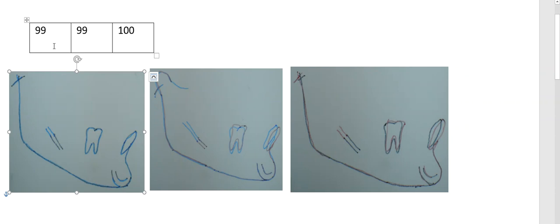If I see my cephalometric values, the IMPA is unchanged, and it's quite clear the IMPA is unchanged here, because I have done nothing in the lower arch during the course of the distal jet, so it's quite obvious. In the second superimposition, you see the comparison between pre, mid and post, and the IMPA is increased and the incisors are proclined. So the IMPA is only 100 degrees.